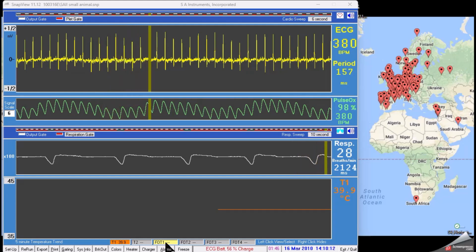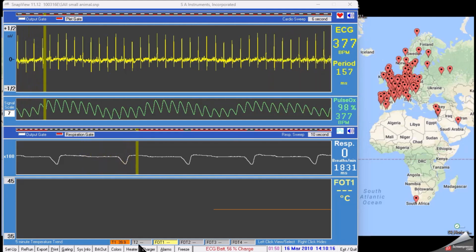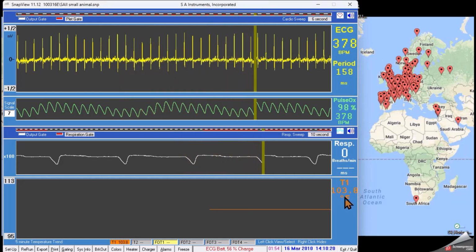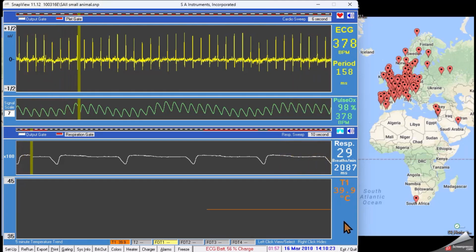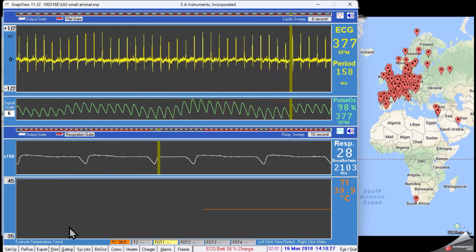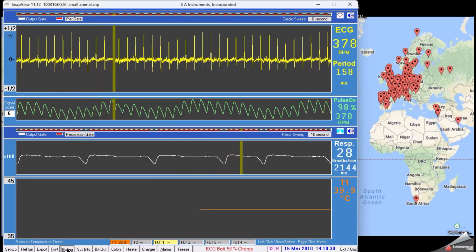2 buttons appear at the bottom of the display. These buttons select which measurement is displayed in the trend and in the digital display on the right. Toggle between degrees C and degrees F by clicking on the unit indication. Reviewing the buttons at the bottom of the display, we already know that the first few are different in SnapView than in PC-SAM. But the next buttons are all the same, starting with the gating button.